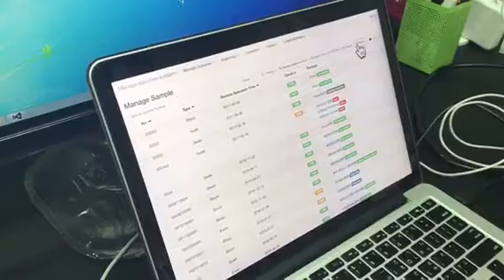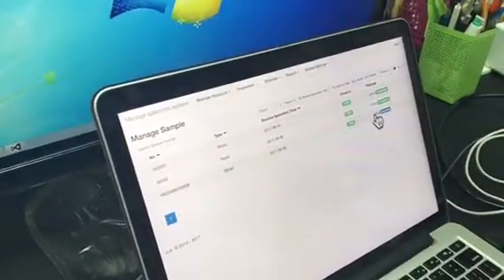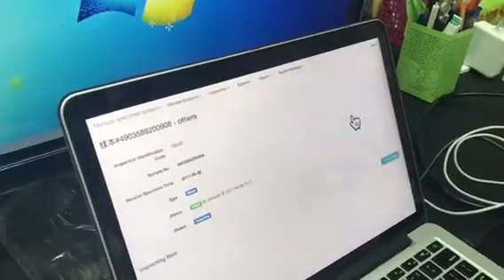Okay, so here is the list waiting for processing. So let's find this tube. You can base on the time, or you can scan the serial number. So let's use the time first. Search. So you will see there are 3 tubes waiting for test. So let's choose the one we just entered.